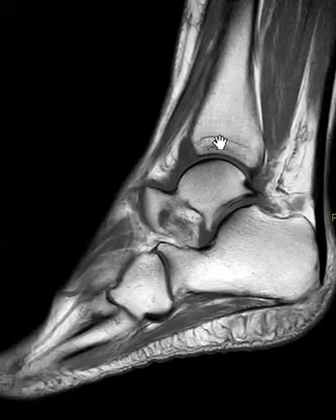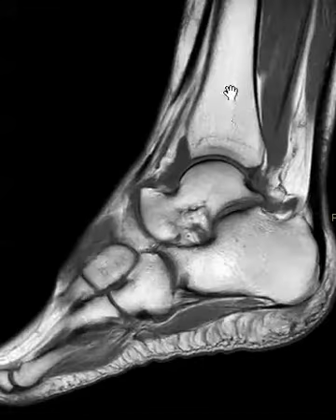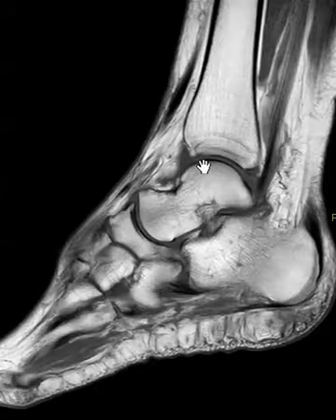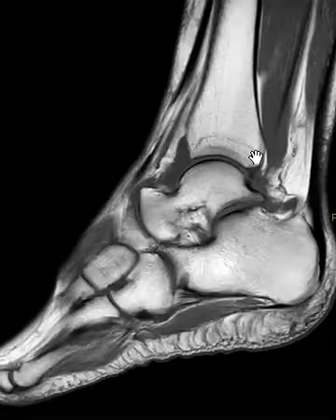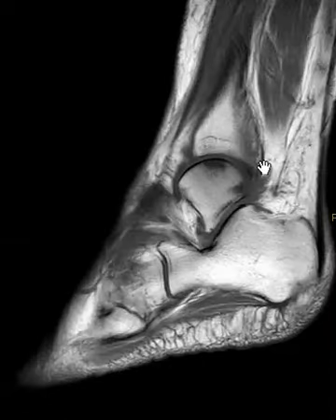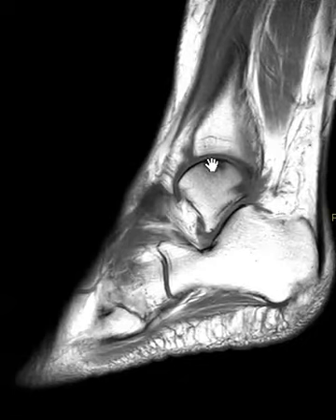Number one, her tibia-talar joint. This is the tibia up top. It ends, and below that we see a rounded area here. This is the talar dome, and this is called the tibia-talar joint. If we go off to one side of the tibia-talar joint, we see an area of darkness right here.